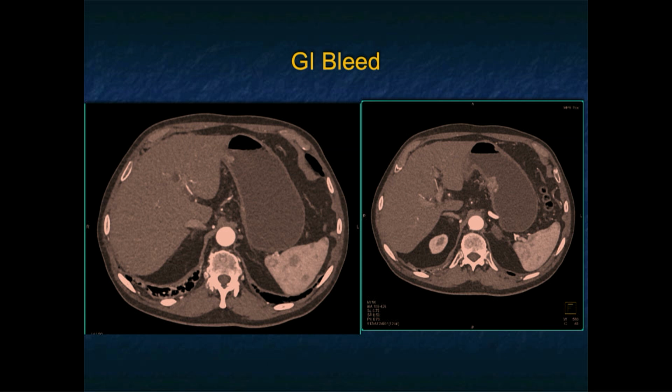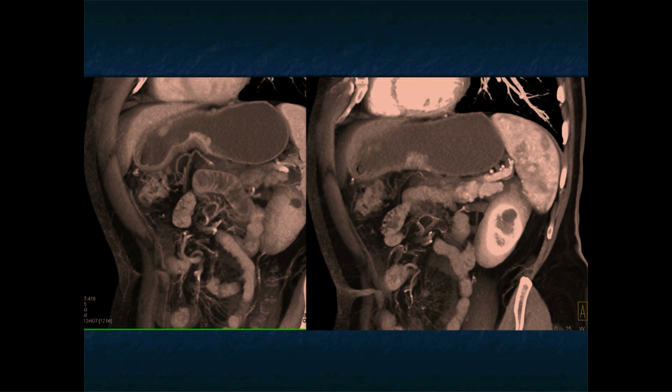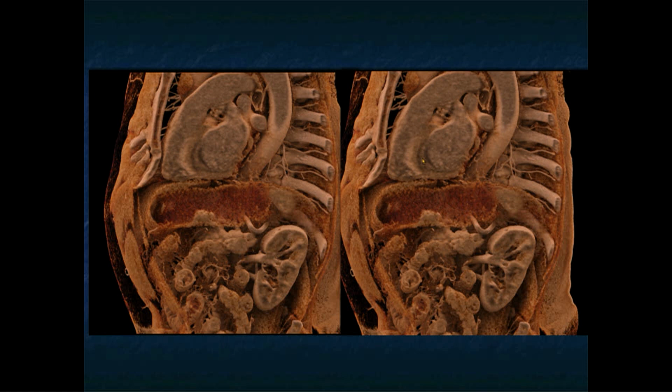And then, of course, by distending the stomach, there's a typical ER patient, low hematocrit, looking for a source of bleed, no specific signs. There's an ulcerating lesion in the stomach, which was a carcinoma. Again, if the stomach was not distended, you would not see that mass. Here it is on some of the coronal volume rendered views, and here it is on the cinematic rendering. This patient would then get endoscopy and subsequent biopsy.